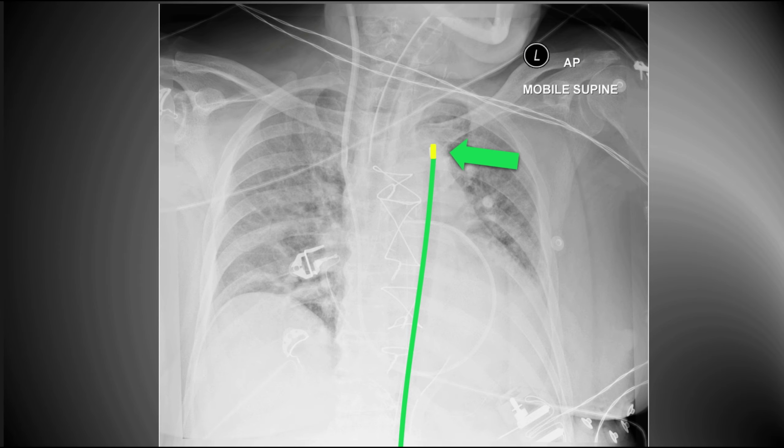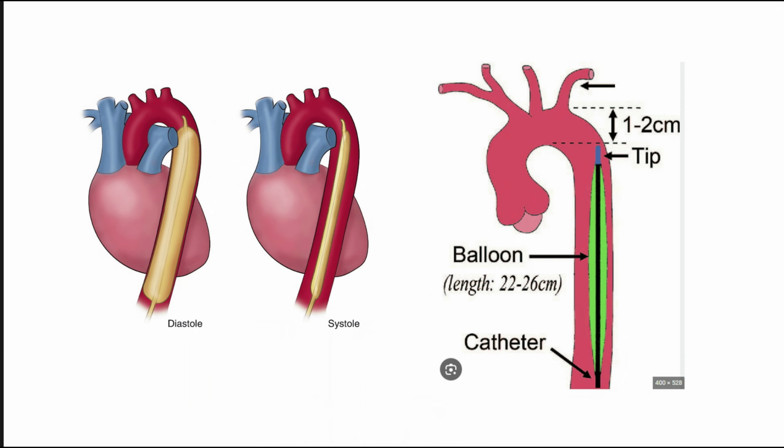This is an intra-aortic balloon pump. They're used to support the perfusion pressures of the heart and brain by a balloon inflating in diastole. These are often placed following myocardial infarction or following cardiac surgery, and the idea is to drive up diastolic pressure, perfuse the heart, and improve overall cardiac performance. The intra-aortic balloon pump must be placed beyond the left subclavian artery, or it will cause ischemia to the left arm.